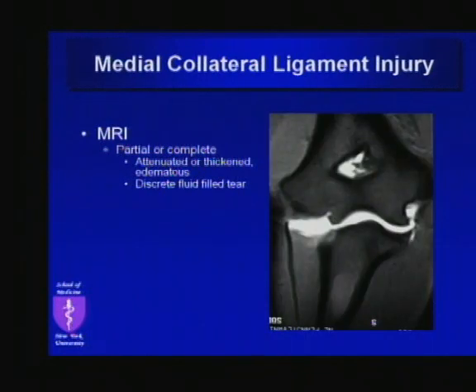Those of you doing arthrography may see this injury, which was popularized in the literature recently, which is a partial detachment of the distal ulnar attachment of the MCL. And the name given to this is the T sign because you can see this T on its side defining the pockets of fluid that you see at arthrography. That's partial detachment of the distal MCL.